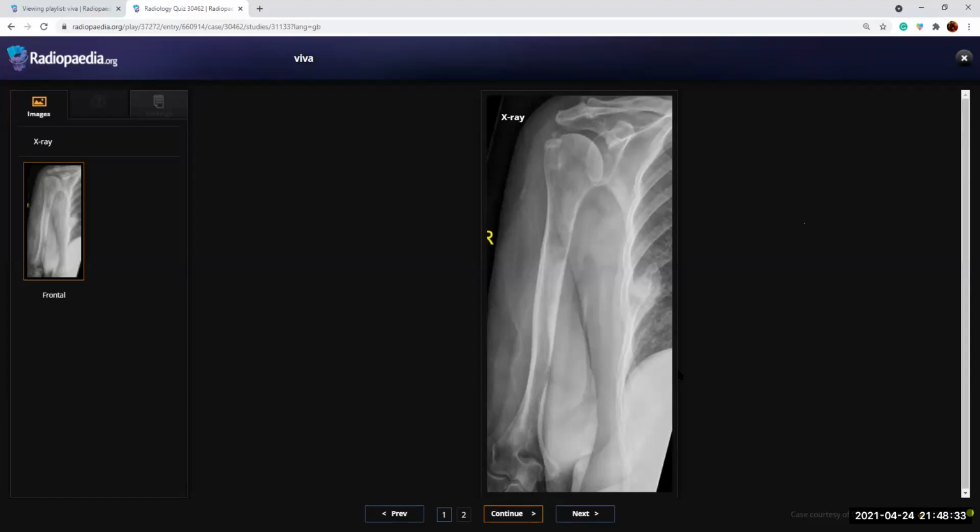Okay. So you mentioned this. So again, you think it is this to here, or you think it's the other way around? It's the bone lesion which is metastasized to the lung. Yes, it can be the other way around as well, that this is a primary lesion of the humerus, which is giving metastatic lesion, pulmonary metastases. Definitely, this could be also another possibility.